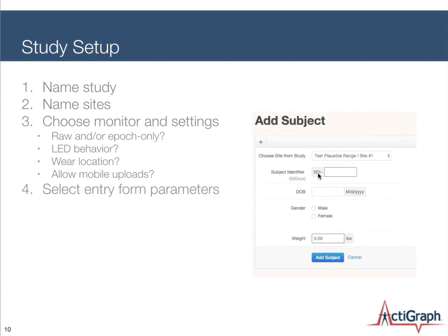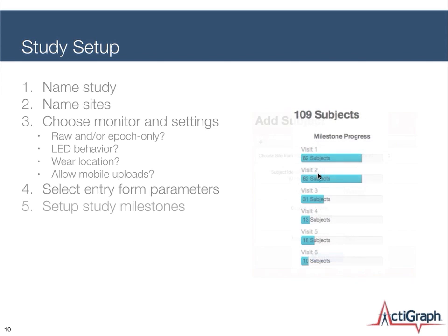Date of birth, what other fields do you want to enter here? Do you want to capture blood pressure? Anything you can think that you may want to capture at this point, we work with you to configure that. Whatever units you wish to use. If you like to use kilograms instead of pounds, that is an option. Date of birth can be configured a different way. So we work with you on that.